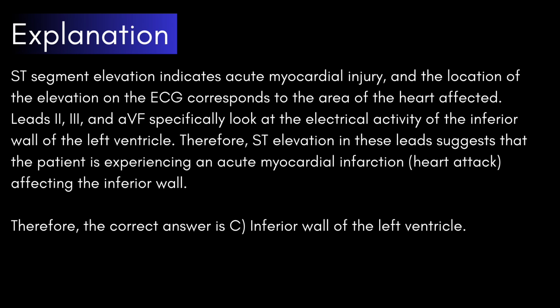corresponds to the area of the heart affected. Leads 2, 3, and aVF specifically look at the electrical activity of the inferior wall of the left ventricle. Therefore, ST elevation in these leads suggests that the patient is experiencing an acute myocardial infarction, a heart attack, affecting the inferior wall. Therefore, the correct answer is C, inferior wall of the left ventricle.